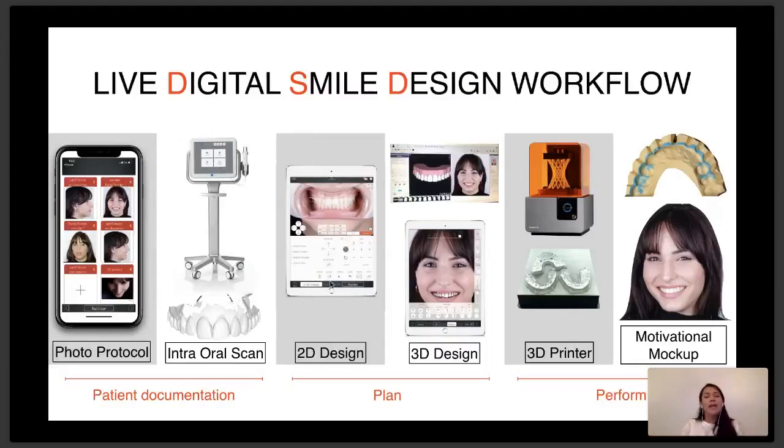Then you're going to create a 2D or a 3D smile design if you like. Then you can print it out and transfer that 3D smile into your patient via a motivational mockup using a putty matrix to create that mockup in your patient. Okay, so this is all the digital workflow that closes up the loop of transferring that smile to your patient.